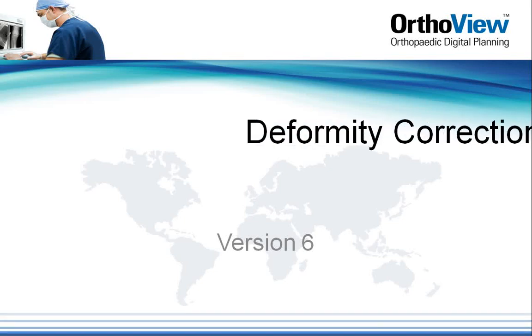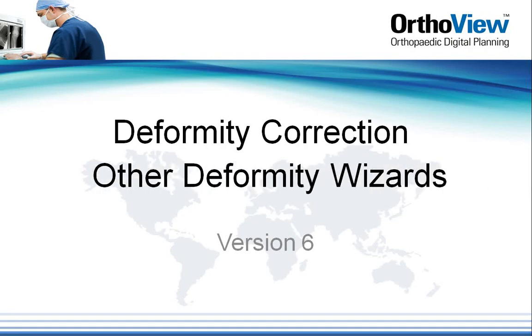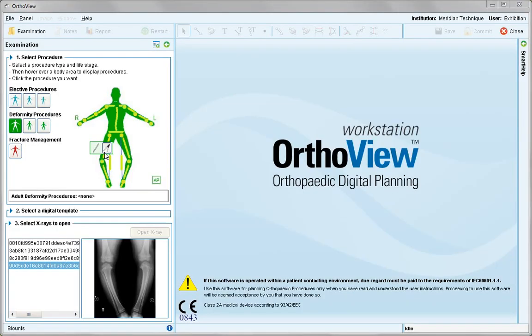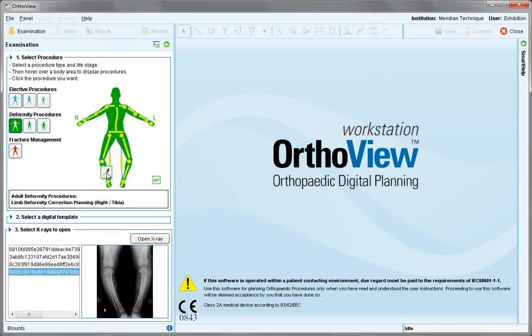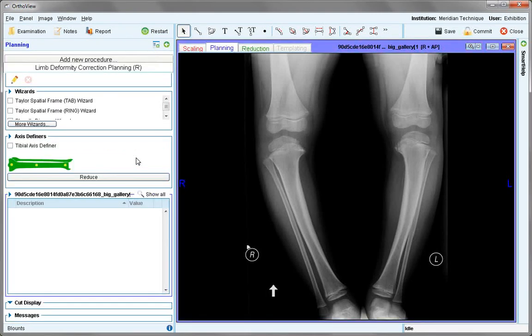In this deformity correction tutorial, we review other wizards in the deformity group. On the individual long bones of the lower limb, if the planning icon is selected, some other wizards appear. Opening this image and scaling using confirm oversize, as we are measuring angles only.